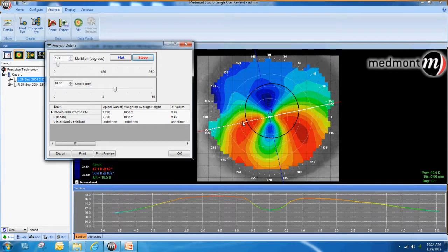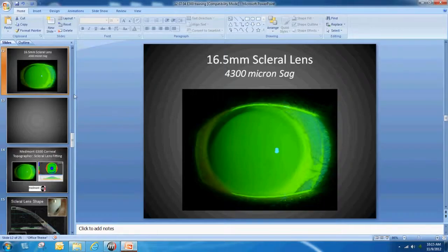Generally, it's better to take the higher of the two values because you would prefer to have your scleral lens go on eye with more depth than required rather than less depth or touch. If the lens has touch, then it needs to be removed with a higher sagittal depth of lens placed on eye. So it's always better to put on a lens with more depth or to err on the higher side in sagittal depth.